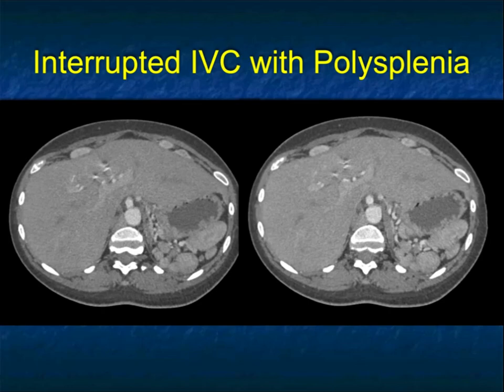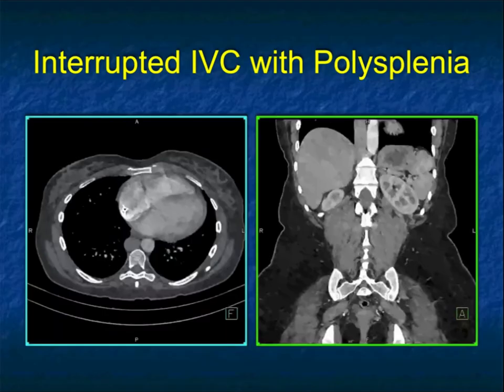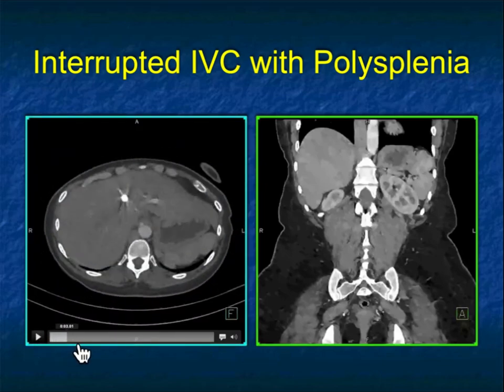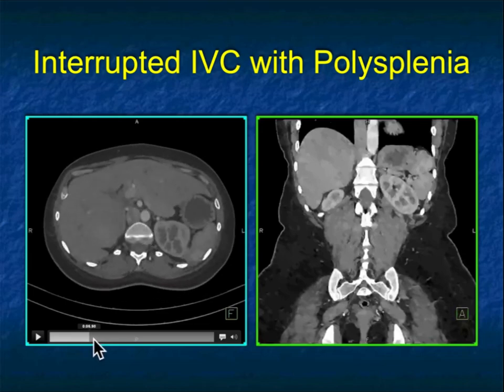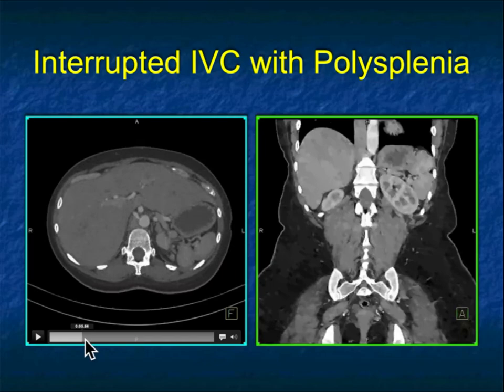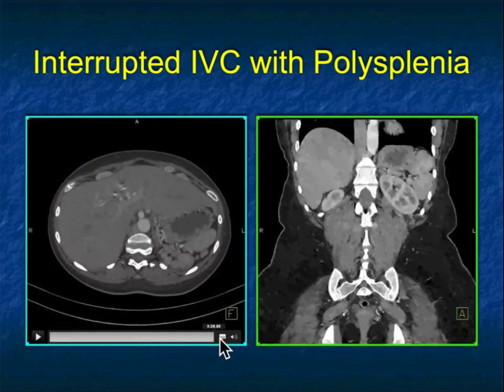They're nearly the same size, but that's not the answer. And again, here it is very nicely on the coronal perspective. A really good example. Now, if you looked at this case interactively, you can see how dilated the azygos is, and as azygos continuation of the IVC, there's no intrahepatic IVC seen on those images. Very nice example showing you that.